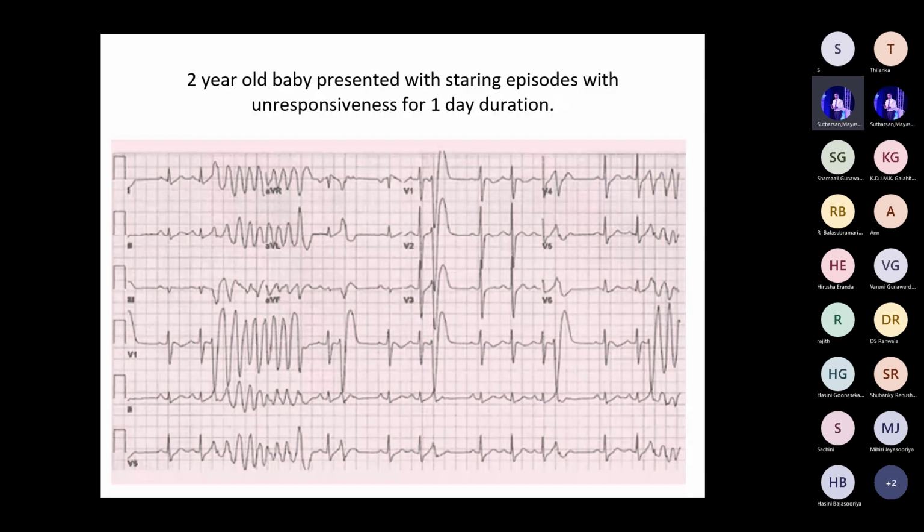Okay, what is this? A 2-year-old baby presented with staring episodes with unresponsiveness for 1 day duration.